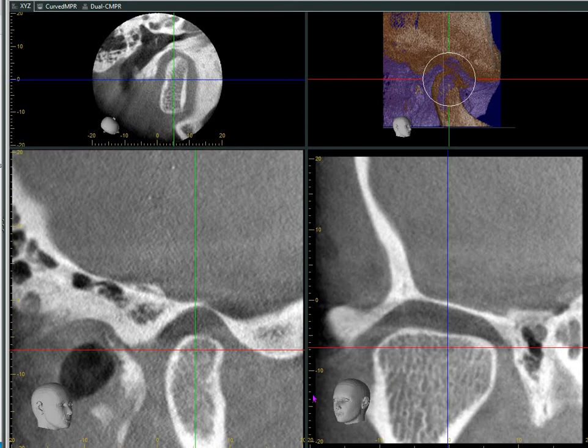Although this scan shows a fairly normal joint anatomy, this patient can still exhibit sporadic migraines due to what you can see here being a thin skull bone. If she develops severe clenching or grinding problems, she can experience headaches as the lower jaw will be hammering this area of the brain. This can happen despite having a normal joint.